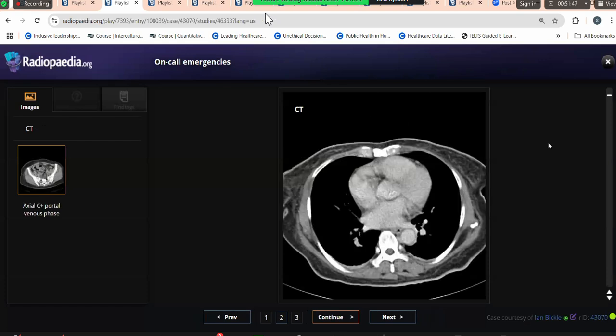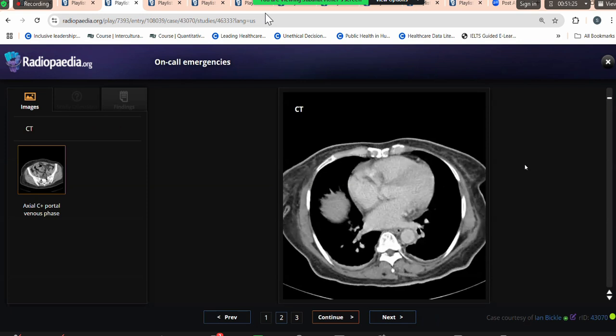So candidate 3, this is your patient. A&E case, acute abdominal pain. Should I ask for the control, ma'am? Yes, please. So go ahead. Can you scroll? Just check. Click on your screen once. Yes, ma'am.